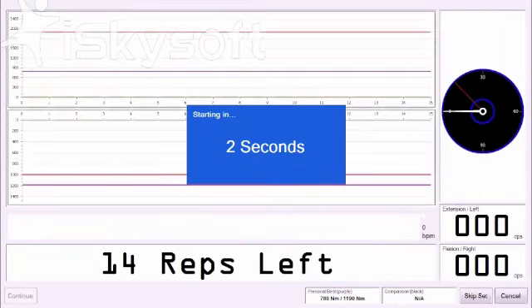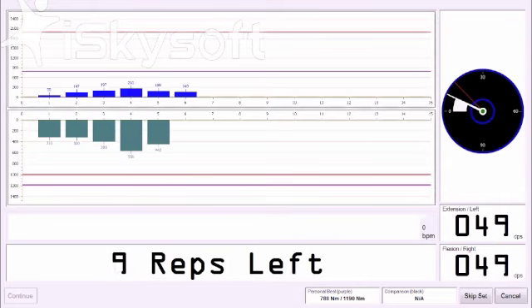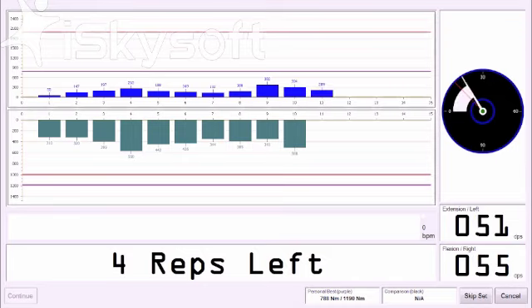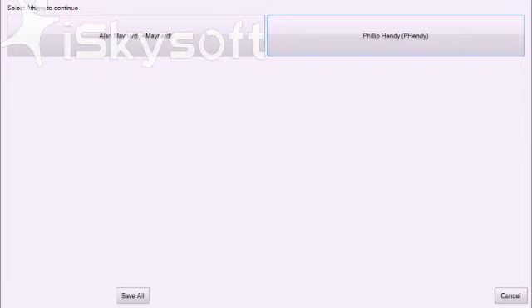You will also notice red lines which directly relate to target torque values which have been pre-set up in the TRS. While the purple lines directly relate to the individual's personal best scores, the red lines are a target for the individual to try and strive and reach each session. For a detailed explanation, once again, make sure you watch the TRS demonstration within routine template management to set up these values.